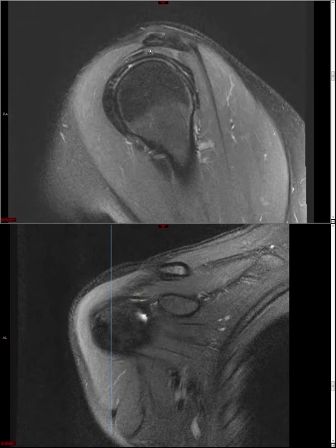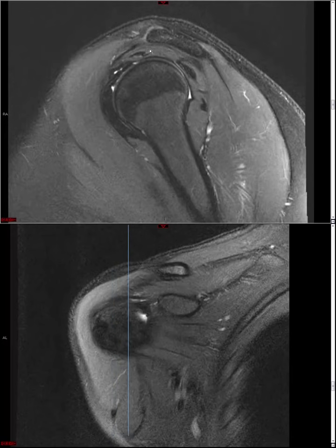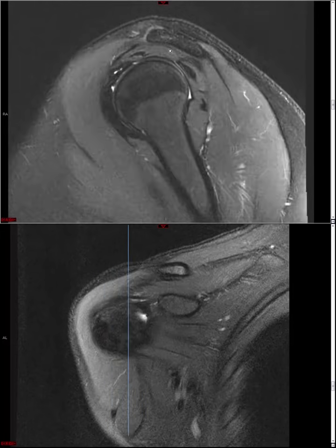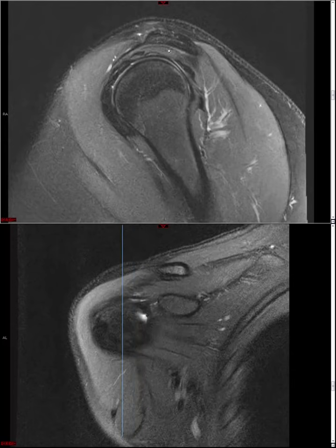And when I report these acromions, I actually don't give a type 1, type 2, type 3. I just say if it's hooked or not, because that's really the important feature. The very rare type 4 acromion is actually convex inferior, and that could impinge as well, but I've seen maybe 1 or 2 of those in my entire career, so I won't worry too much about that. In addition to having a type 3 acromion, you can actually have a subacromial enthesophyte at the acromion anteriorly, and that too can behave essentially like a type 3 acromion and cause rotator cuff impingement.